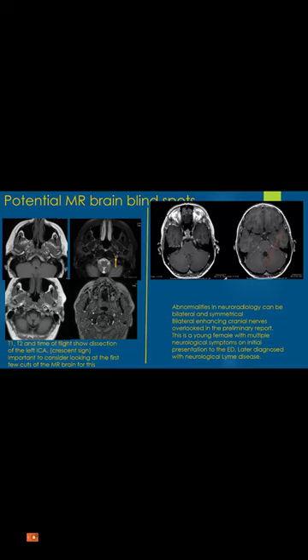Everything is fine, but there are bilateral symmetrical enhancing cranial nerves that can be easy to miss because they are bilateral and symmetrical. We have a tendency to ignore things that look like each other, especially when looking at the brain. We usually focus on things that are odd, like unilateral. So just keep in mind that this might be a miss.